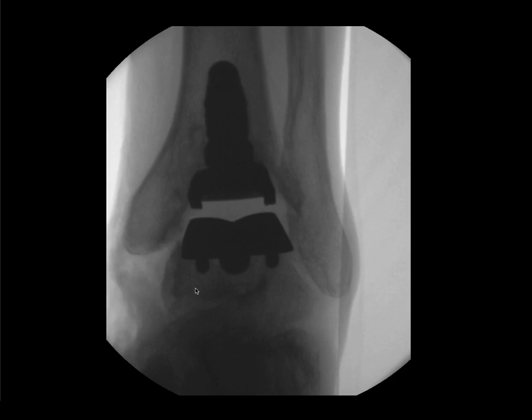So this is one of the principal uses of bone scintigraphy in ankle prostheses. Is there an abnormality, i.e. is there increased activity? Is the activity around the prosthetic components, which may indicate loosening or infection? Or is the activity localized to an area around the osteophytes in the gutter area, as it's called, and they could possibly be treated simply by a localized surgical procedure. So that's your role in these cases.